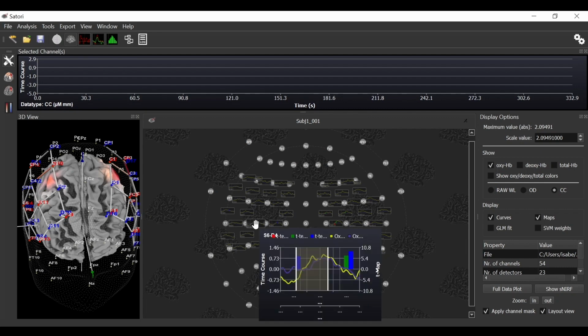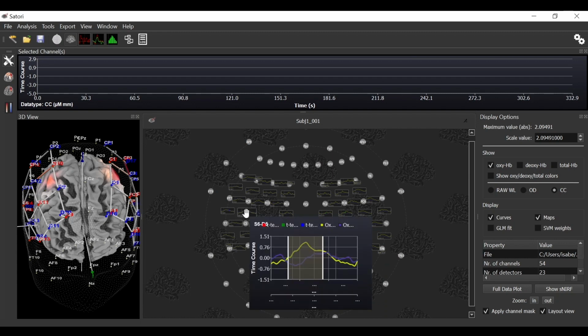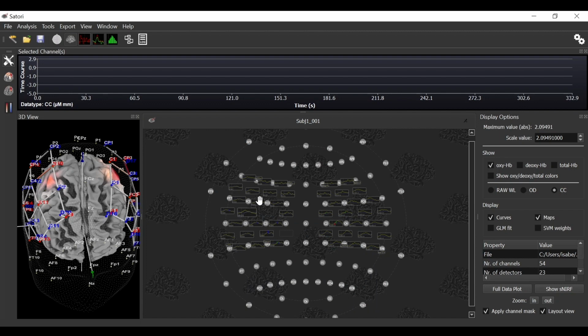When clicking through the different contrast results, one can find only sparse results in comparison to the previous map, which is expected due to the difference in the two approaches. Now, we are actually looking for consistent effects in the different subjects of the sample, and thus have a lower chance of finding a significant result.